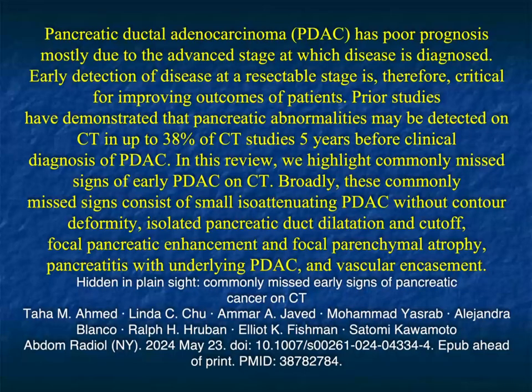Pancreatic cancer has a poor prognosis due to the advanced stage. Prior studies have demonstrated that pancreatic abnormalities may be detected on CT in up to 38% of cases, even 5 years before diagnosis. So in this article, what we did is look at the signs that were very helpful for early disease that are often missed and try to emphasize to everyone, look very carefully.